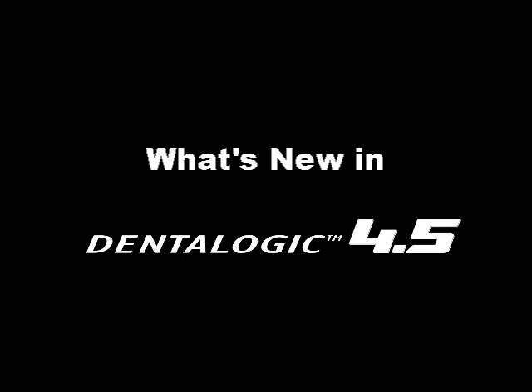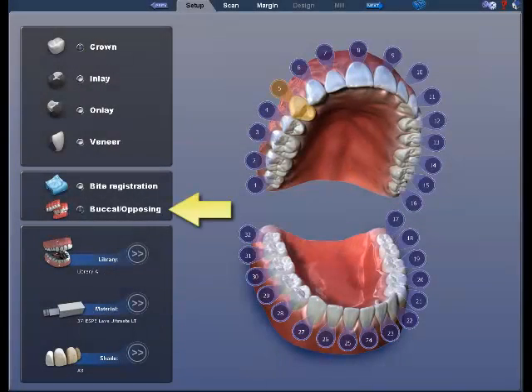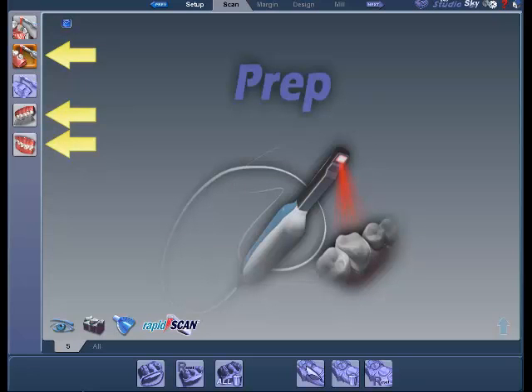Welcome to the What's New in version 4.5. As an alternative to using bite registration or clone, you now have the ability to scan opposing dentition and the buccal bite. The three models can be scanned in any order.